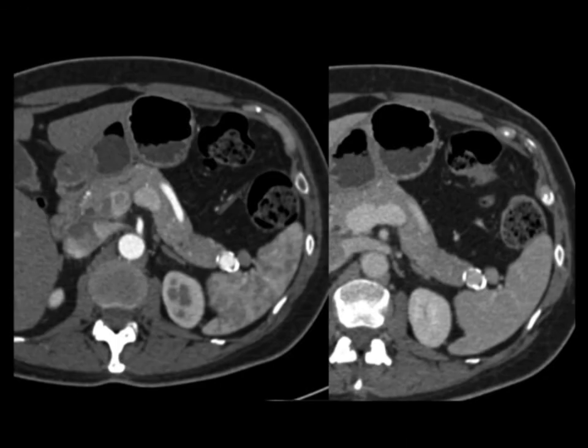It's interesting, look at it on the arterial and venous phase imaging. You see how it washes out, and that should have made you think that you were dealing with an aneurysm, okay? Just a very nice example.